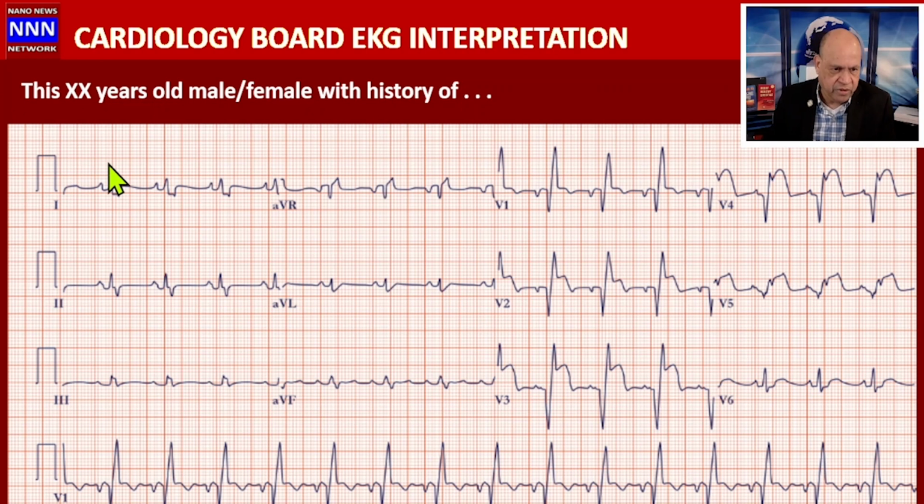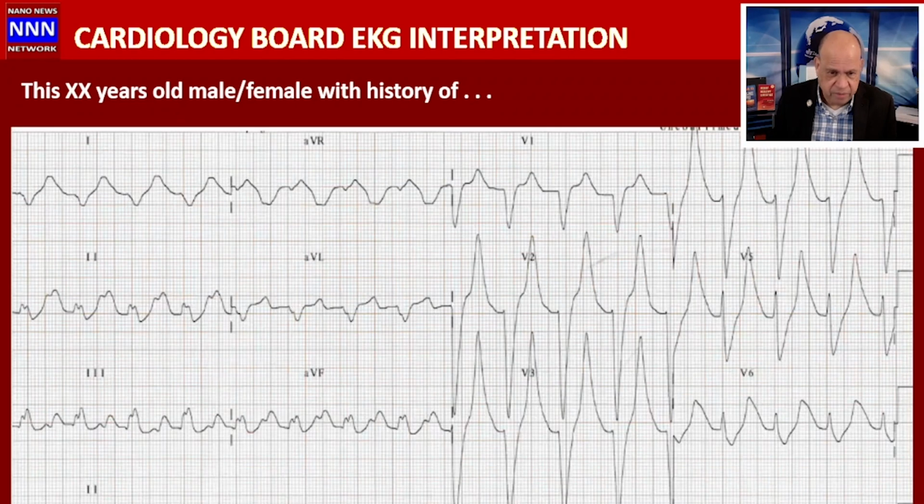So that's where I would mark sinus rhythm, low QRS voltage in the limb leads, left atrial abnormality, anteroseptal myocardial infarction, recent, right bundle branch block, and ST-T abnormalities suggesting myocardial injury. It's a lot in this EKG.